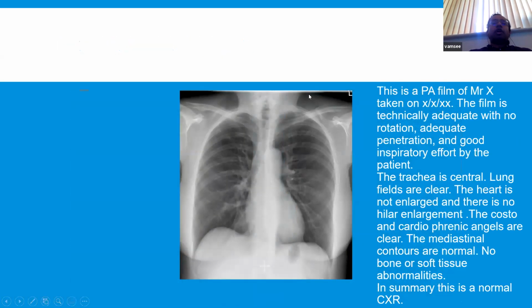Right, so I just thought I'd summarize a lot of what I mentioned. This is how I would, for example, present a chest X-ray. So always, now with a lot of my cases, I have to apologize, I haven't added things like the name of the patient, or even a fake name, and the date which it was taken on.